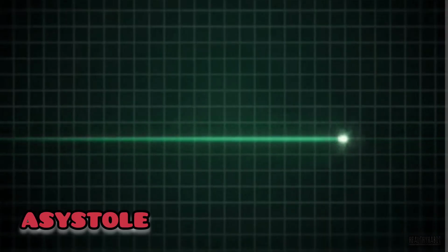Asystole, colloquially referred to as flatline, represents the cessation of electrical and mechanical activity of the heart.